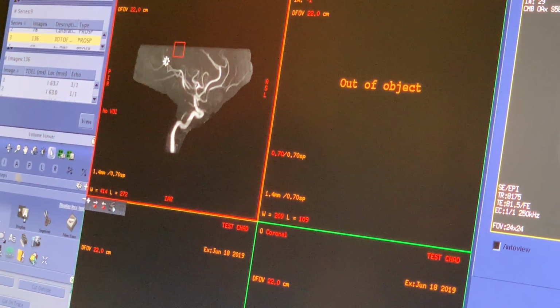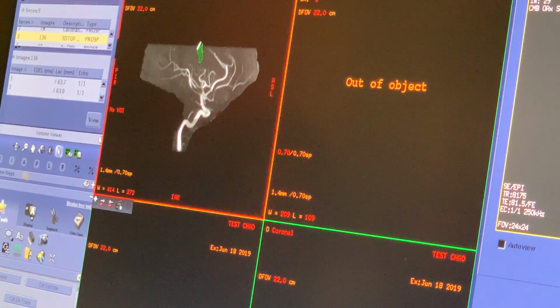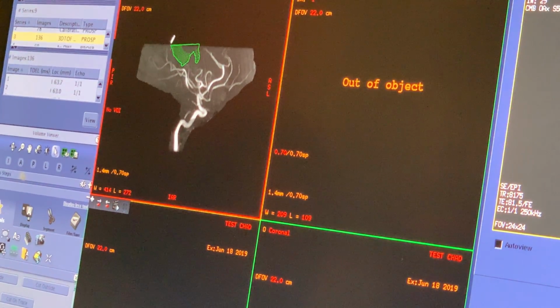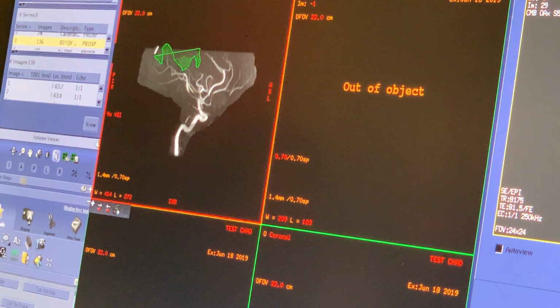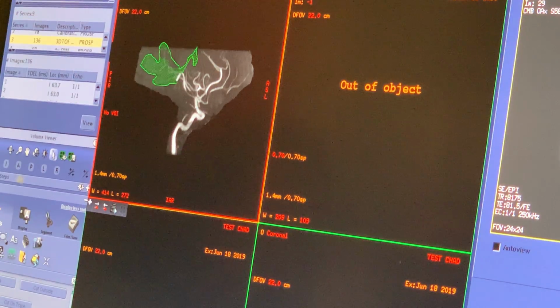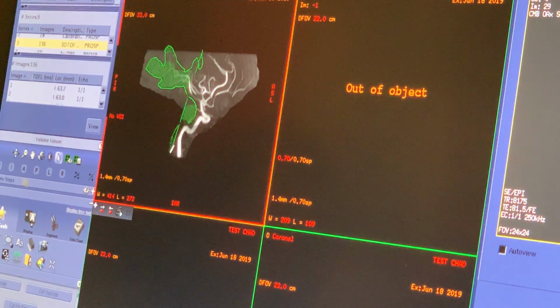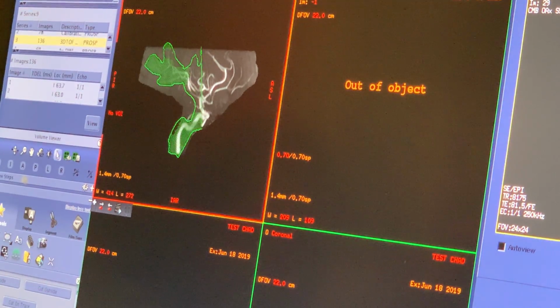All right, and again, there are some technologists that would come in here and they would cut like this, and they'd cut around here, and they'd cut over here, and they'd cut this out here like this, and they'd go around here like this, and around there, and you know, they would literally do this. But I want to show you the difference here.